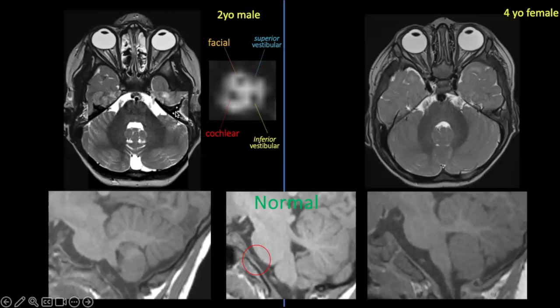But if I tell you that this patient had retraction of the globes on attempted adduction at birth and this appearance, then this is consistent with Duane syndrome, and this is an autosomal dominant disorder. In the latter case, if you look closely at the back of the pons, we don't see the facial colliculi as we do here at the midpoint of the pons where the trigeminal nerves are coursing.